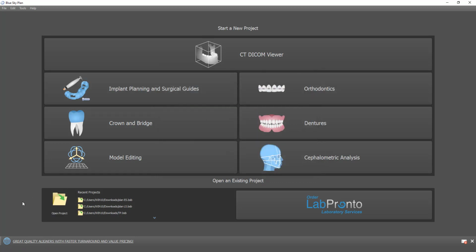It includes some improvements, including automatic AI-driven nerve detection. You don't have to click anywhere. You don't have to do anything. It automatically detects the nerves for you. It includes other improvements to automation that we have, for example, the STL to CT scan alignment of the model. It includes some improvements to the process flow.